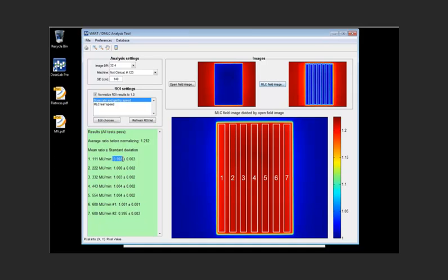And so we look at the ratio of these strips individually, and they should be 1 plus or minus 2% as variance tolerance. And here we can see that the highest deviation we have is 0.7%, so this test passes. We can also do the same test with MLC leaf speed. That just uses slightly fewer strips, but it's the same analysis, using your EPID to collect 2 images and automatically doing the analysis in DoseLab.